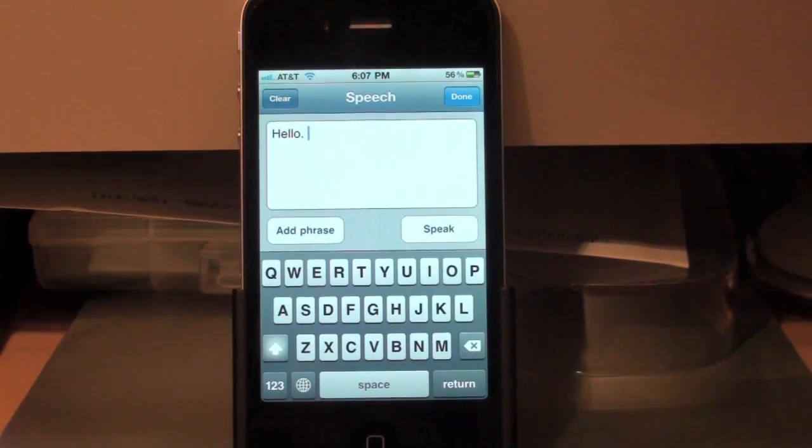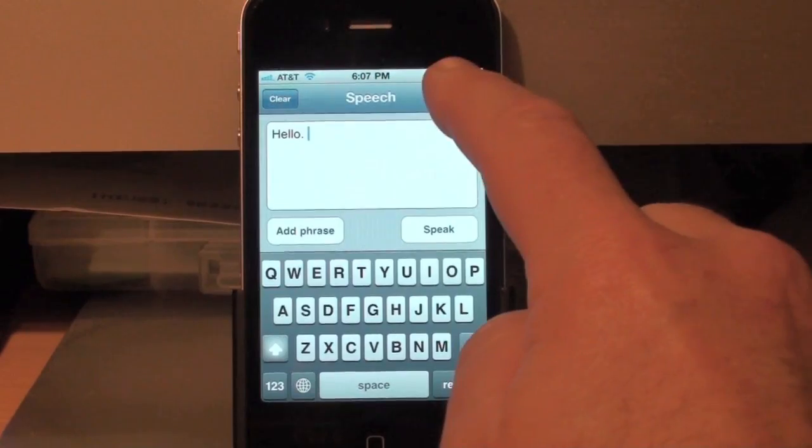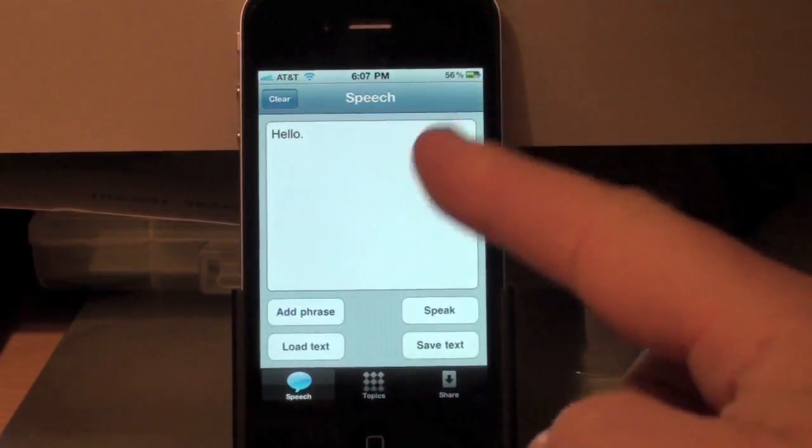Hello. That's the Neo Speech voices. They're the very best voices on the market today. They are male and female, English, US are included. And let me come back here. I'll press the done key. Give you a tour around the screen here.